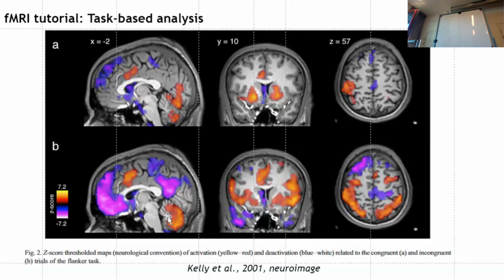But if you look at your data, you will find some aspects of it. Deactivation is in purple, and they look at activation. You see that the activation here is a little bit higher than here, and for other regions too, such as medial prefrontal and stuff like that.